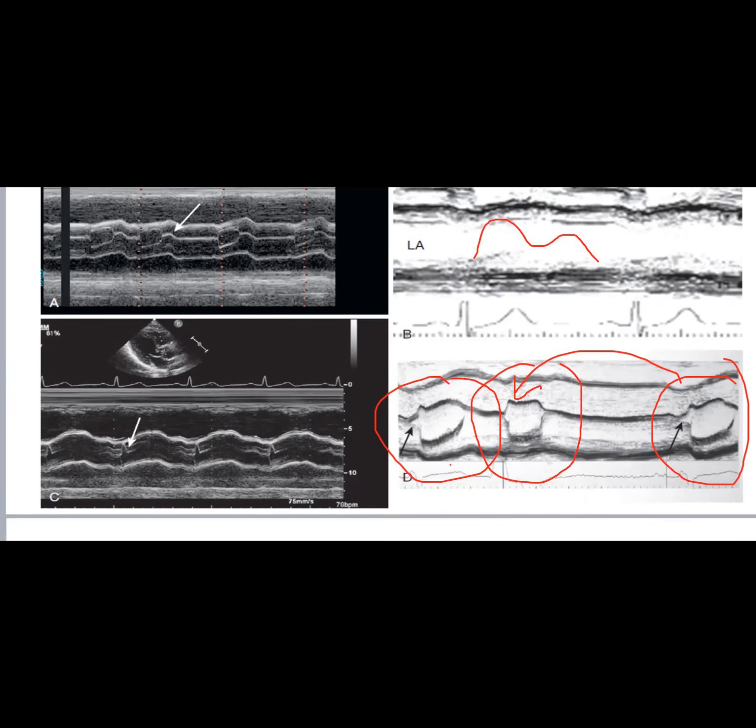So that means the pre-existing diastolic pressure is high, and upon that we have an increased filling because of the pause. So these two factors come together to open the valve prematurely. But usually when the aortic valve opens prematurely, it means I have a pre-existing diastolic dysfunction. Okay, like in this case.